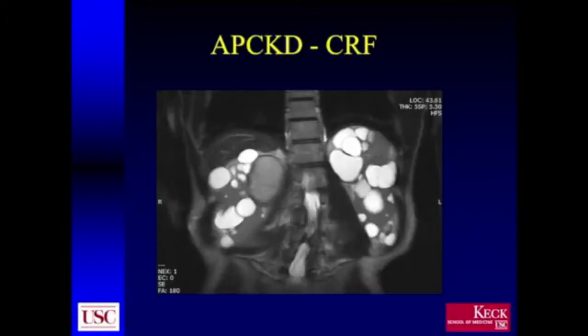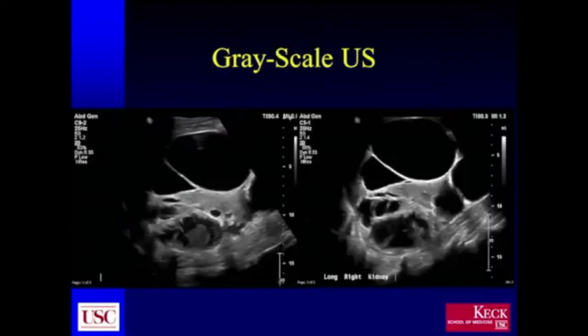This was a patient who obviously had adult-type polycystic kidney disease and a history of chronic renal failure. You can see these multiple cysts identified in the enlarged kidneys on the non-contrast T2-weighted MR, but you can also very easily see that there's one of these cysts that clearly has a very different signal intensity and was of concern. On the non-contrast ultrasound, I think our concerns grew in that you can see here that there are various thick and nodular septi. There's a large mass-like area centrally.